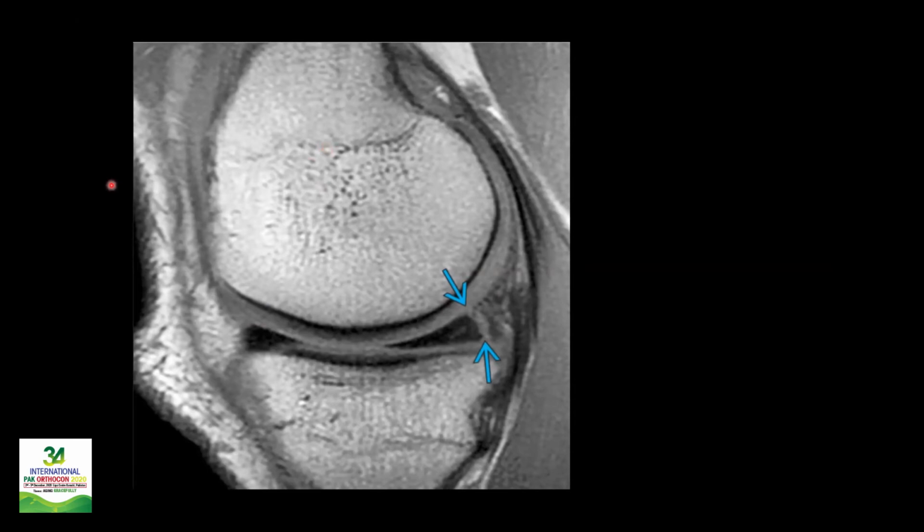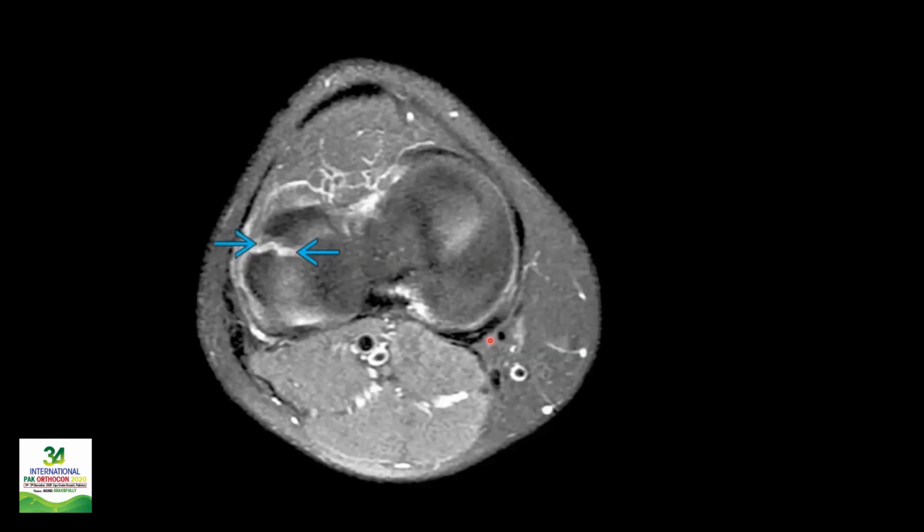Okay, so this is again a tear extending from the superior surface to the inferior surface along the lateral side. So this is again going to be a vertical longitudinal tear. Which one is this one? Okay, what is happening here is that you can see a defect running from the free edge of the meniscus, extending into the periphery, separating these two parts in a radial fashion. So this is going to be a radial tear.